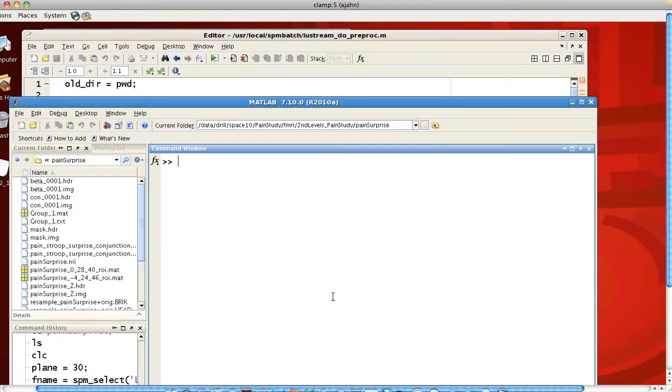This tutorial will cover one of John Ashburner's code gems, which are just code snippets which allow you to do really cool things in SPM. Some of them are useful and some of them are more for show, but they're all very interesting and they will increase your understanding and appreciation for how MATLAB interfaces with fMRI data.